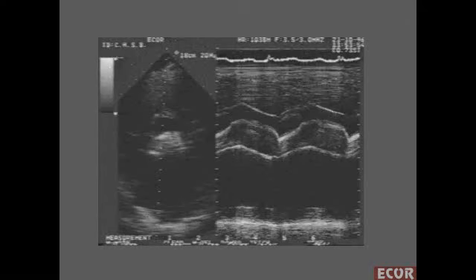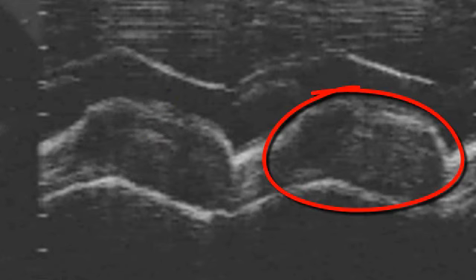Now, the M-mode of the valve. Is it calcified? Absolutely not. There is a huge vegetation. 2D echo cannot differentiate it. For the M-mode, it is very easy. See the smudge aspect. No characteristic lines with clear border as seen in calcifications.